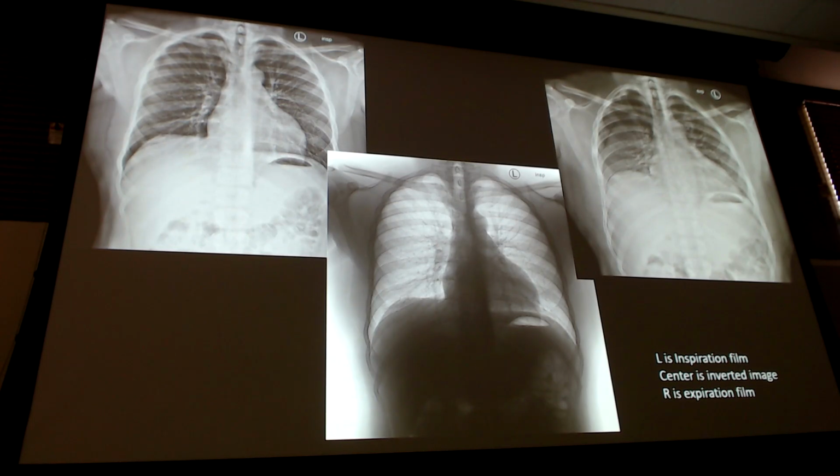Right? Again, why? Because there's no pressure in the lungs now. There's no outward pressure pushing the lung tissue out. When they take a deep breath in, it's going to go right back to this. That's fine, that's good. The lung is able to get out. But you can see why that expiratory film really makes that pneumothorax pop, because the pressure changes and now that lung tissue just gets shoved down and pushed. Not causing any major pathophysiologic issues with that, because you're exhaled anyways. The lung is going to be smaller. And then when you breathe in, you get back to this area here.